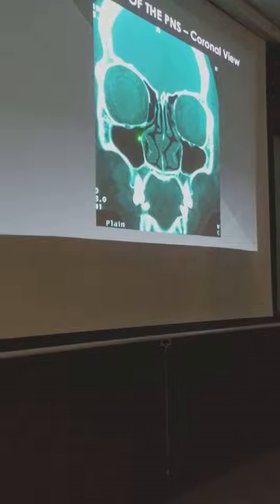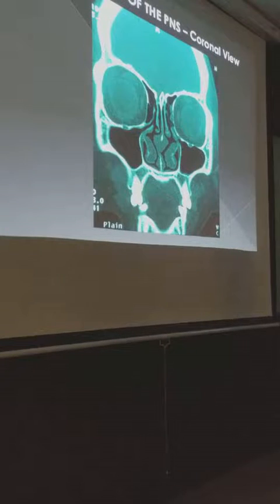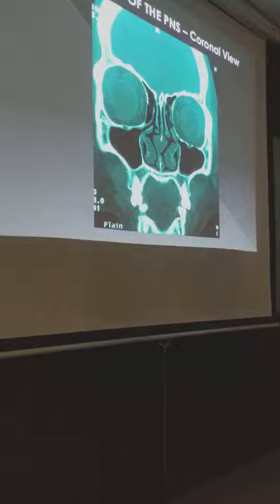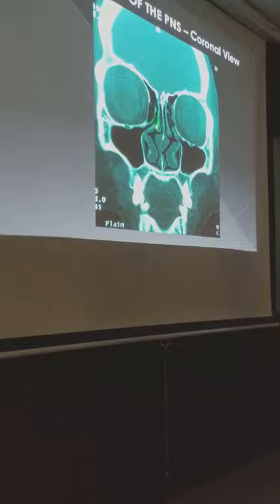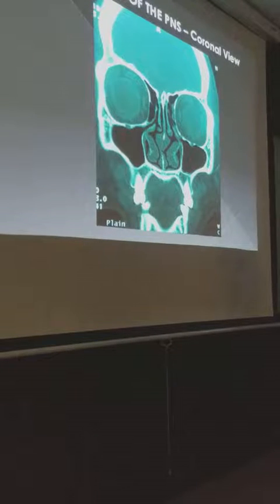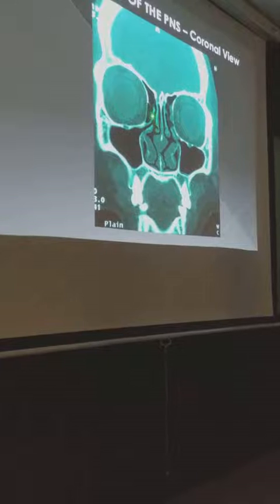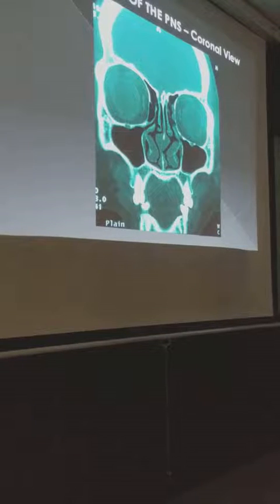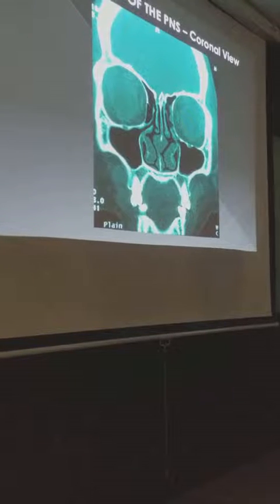And then leads to the maxillary sinus ostium. Okay. Actually, the infundibulum is where all this anterior group of sinuses drain. The frontal, the anterior ethmoids, and the maxillary sinus. It's in the infundibulum. So, yun ang tatandaan nyo. A two-dimensional space, hiatus semilunaris inferioris, opens into a three-dimensional space, the infundibulum.